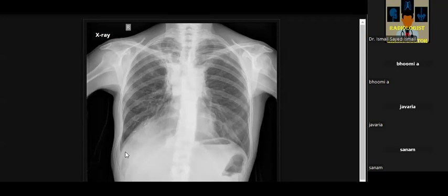In the presence of surgical clips in the right chest wall, my most likely differential would be radiation fibrosis. Excellent. It is most likely radiation fibrosis causing reduced lung volumes.